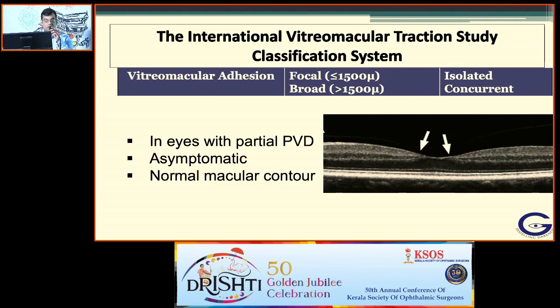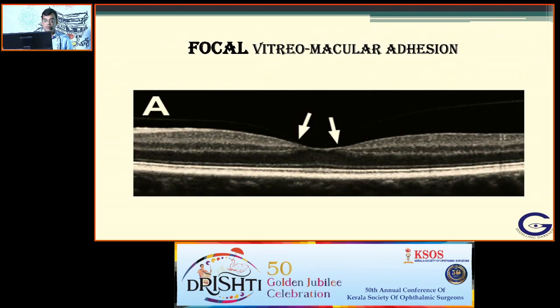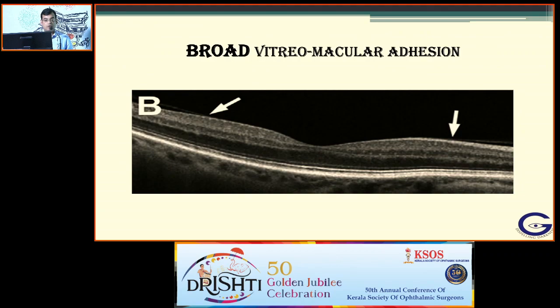It can be a small adhesion, a small attachment, or broad based. This is a focal adhesion or a large area of adhesion. Just an observation more than a pathology.